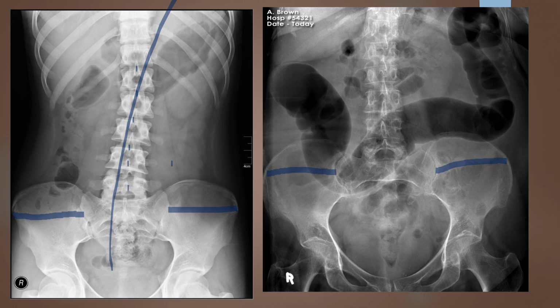So I'm not going to be able to evaluate that one, but I can still come look at those ischial spines. Here I see a spine. Here I see a spine. They look relatively symmetric. So really the mid-coronal here and the pelvis looks pretty good. We're going to follow those spinous processes up the lumbar, and they look good low, but as we get towards the top, I'm seeing them move a little bit. So in the pelvis, they're a tiny bit LPO.